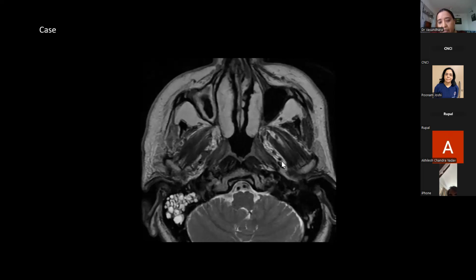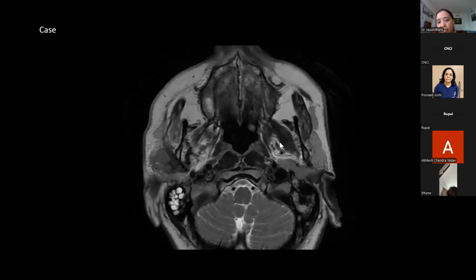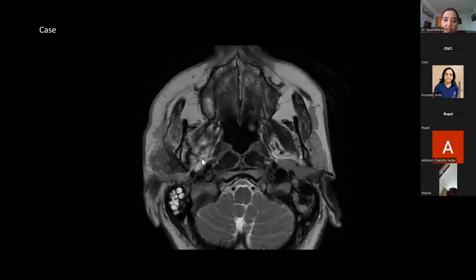these pterygoid muscles, same as the inferior alveolar, but it travels a little anterior to it. So these are the two, lingual and the inferior alveolar. The inferior alveolar goes behind and comes over here, whereas the lingual travels anteriorly, reaches the ramus of the mandible, and then travels in the lingual groove. Same over here. This was a perineural which was then antegradely involving the lingual. So lingual thickened, inferior alveolar thickened, going down. This is the lingual and the inferior alveolar.